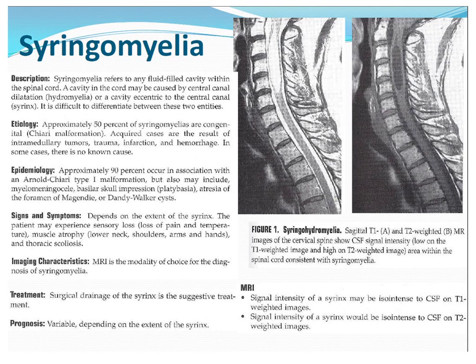You see a little bit of it beginning again in the thoracic cord, because sometimes it can be over a segment and then it stops, or it looks like it stopped and then it opens up again further down. If you see something at the edge, it might be useful to check with the radiologist, see if they want to extend the imaging any lower, make sure they're getting the full extent, or see if they need to have the patient come back for another study or anything like that. This doesn't usually need any contrast administration, so just a non-contrast study is fine.